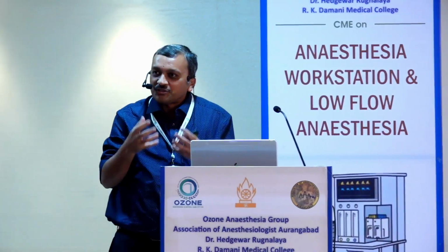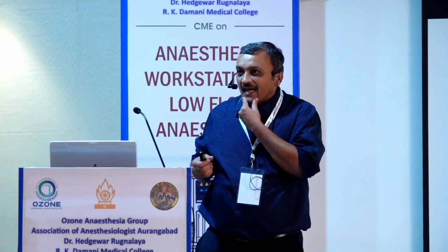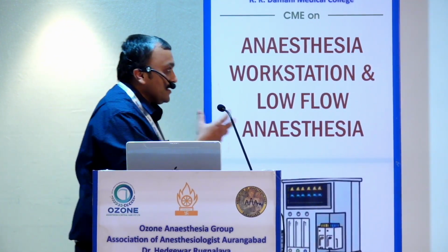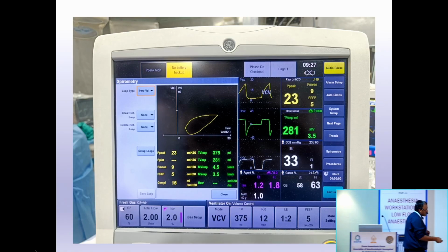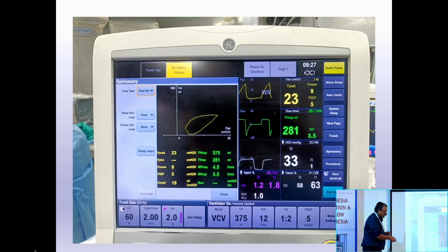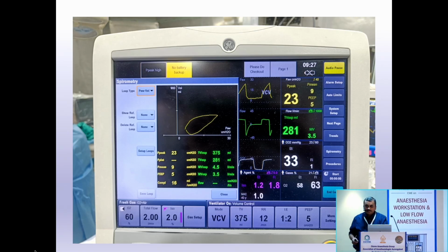We have seen the machine, and now these machines, the flow sensors, what sir talked about, and the pressure sensors, are going to generate certain numbers, certain diagrams, waveforms, and we need to understand those things. We have seen the technology, and it is going to generate a certain amount of picture. You will have certain loops, you will have scalars, you will have numbers, you will have this tidal volume, minute volume, your PEEP, and various types of pressure, especially with the newer anesthesia workstation. It is very important for us to understand.